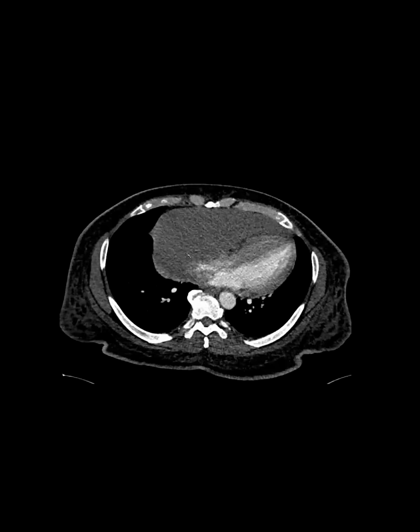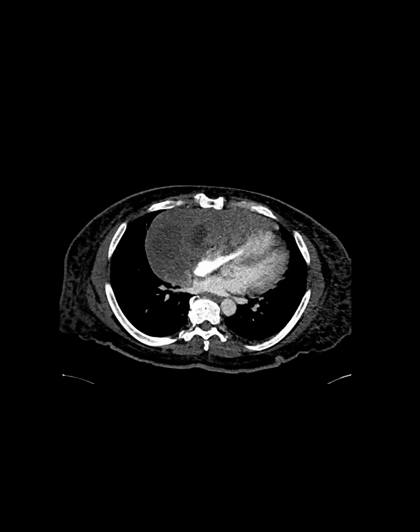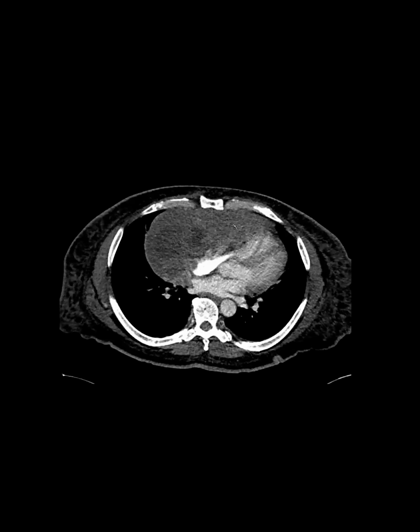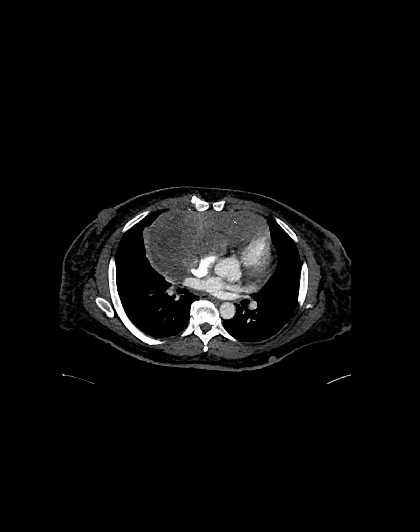But it took us like 7 different biopsies to get the diagnosis. So it was a conundrum. They basically biopsied this mass multiple times. They used ultrasound. They targeted soft tissue areas. It wasn't that hard of a thing. And most of the time they got blood, and they got a lot of blood. After they did the biopsy, it was just gushing out blood, and they ended up having to gel foam it.